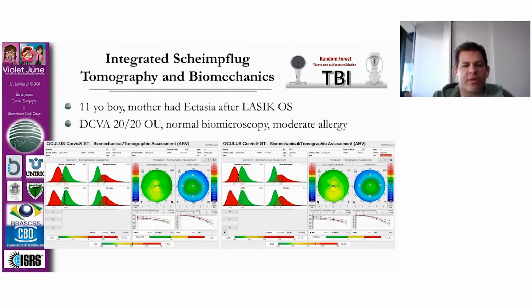Don't rub your eye. Rubbing is bad for you. A lot of people like Damien Gatinel say that it's sine qua non for corneal ectasia. I would say it's not that much the case, in my opinion, but it's very important that this patient does not rub the eye because he has very early signs of ectasia susceptibility. And even the TKC in the left eye would be possible here. So this patient may even qualify for asymmetric keratoconus.